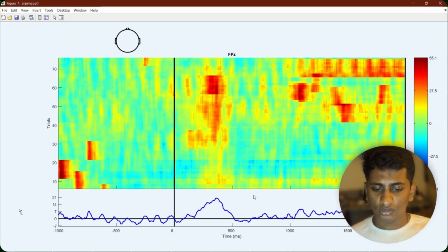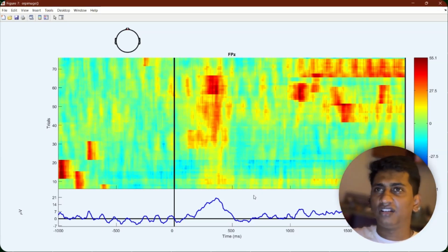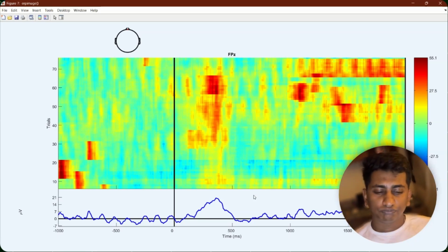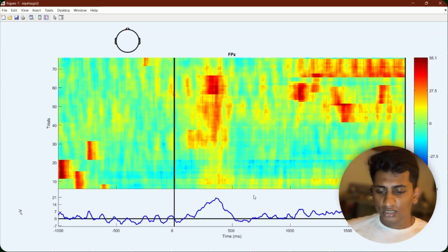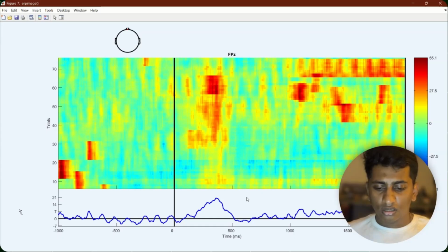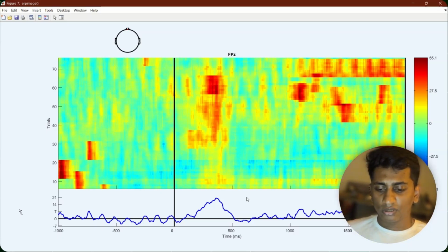Next I'll be marking the criteria to reject bad epochs. Basically you put an amplitude threshold. These are voltages only, so I'll put a threshold of plus or minus 75 to 100 microvolts. Strictly for ERP, the joint probability will be greater than 3 standard deviations, and muscle bursts will be around 80 hertz. We'll remove the epochs with bad channels, around 25%, or replace them with interpolation. So the parameters will be an epoch amplitude threshold of plus or minus 75 microvolts.